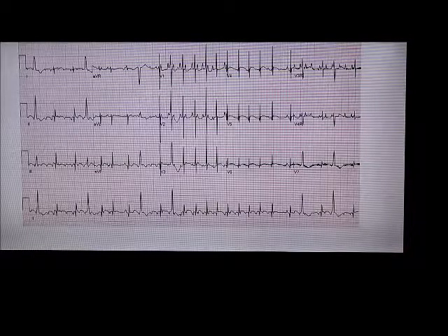Yes, yeah. So before I say that, the P waves are not actually the same morphology. So this is downward notched, this is downward regular, this is downward. So there's probably 3 different morphologies. So that's multifocal atrial tachycardia. And then usually you try to give one diagnosis for the ECG. There's rarely multiple types of arrhythmia at the same time. So if you have multifocal atrial tachycardia with some wide QRS complexes, then they're most likely aberrant QRSs.